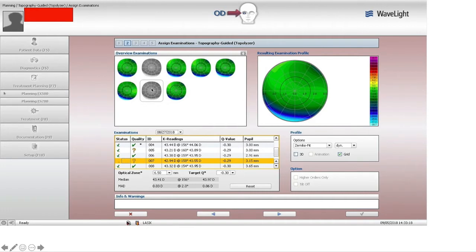Okay, so we know that as we're at the Alcon planning laptop computer, we're going to deselect certain Vario images that we do not think are of high enough quality. And on some of my other talks, you've seen how I use the MAD number to do this. But regardless, each time as you go through this, before you get to the Alcon Contura planning screen, you've got to eliminate these Vario images. The problem is it can be hard to keep track of this.